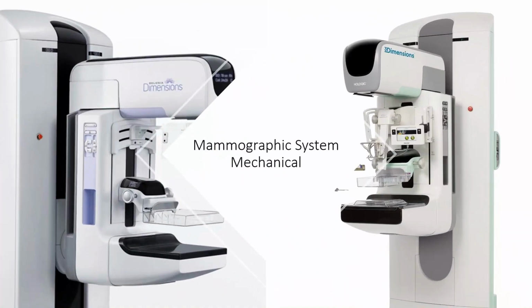In positioning the patient, we also need to be able to position the equipment. Therefore, we have mechanical positioning of the different components within the system. Vendors look at the interaction of the mammographer with the system and how it can be positioned as a key in selling their product. This means that although the functionality is similar, each machine has its own idiosyncrasies in manipulating the mechanics of the system.